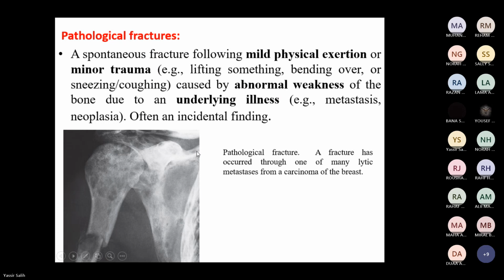A pathological fracture is a fracture that occurs on a background of unhealthy bone. Anyone to comment on this image or the bone in this image? Ignore this abnormality. The trabeculation is a problem in trabeculation. The trabecular pattern is altered. Yes, what else? Lytic lesions. Thank you. What do you mean by lytic lesion?